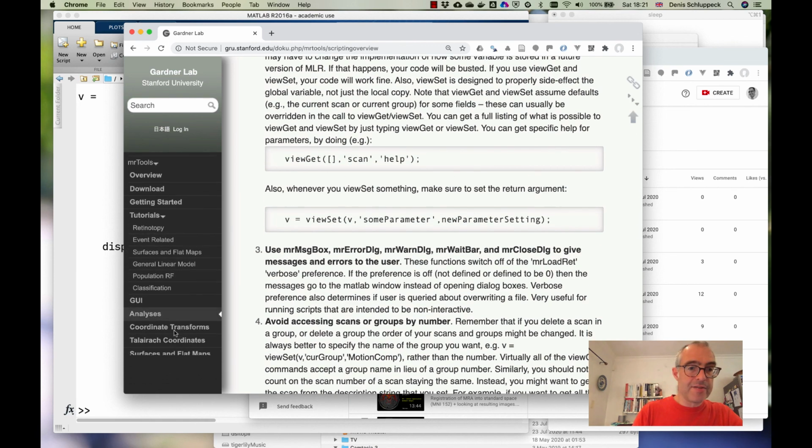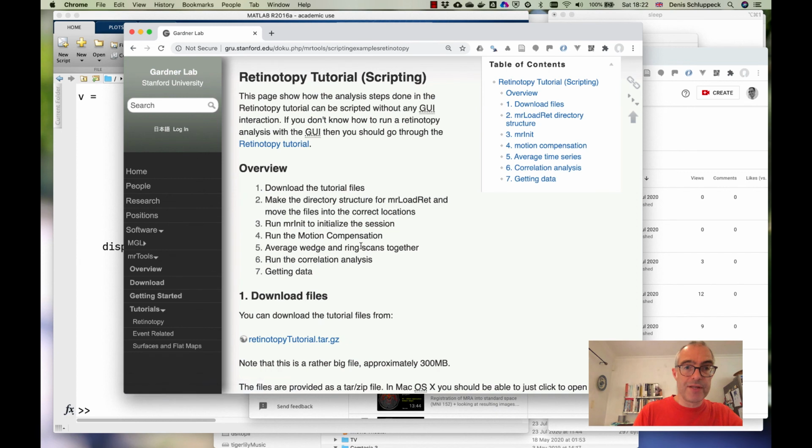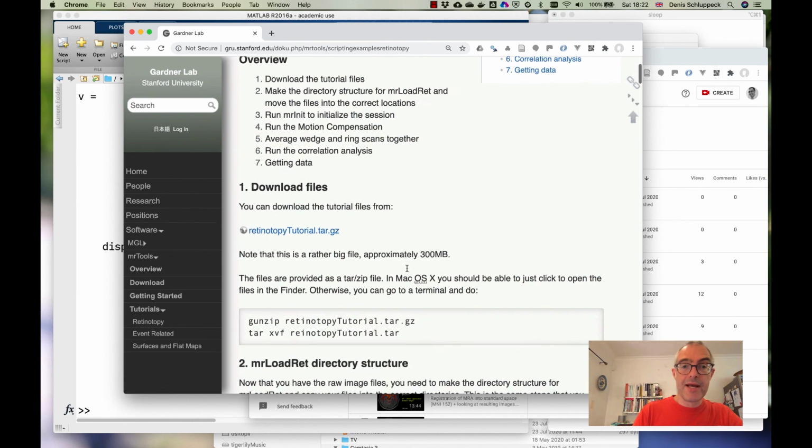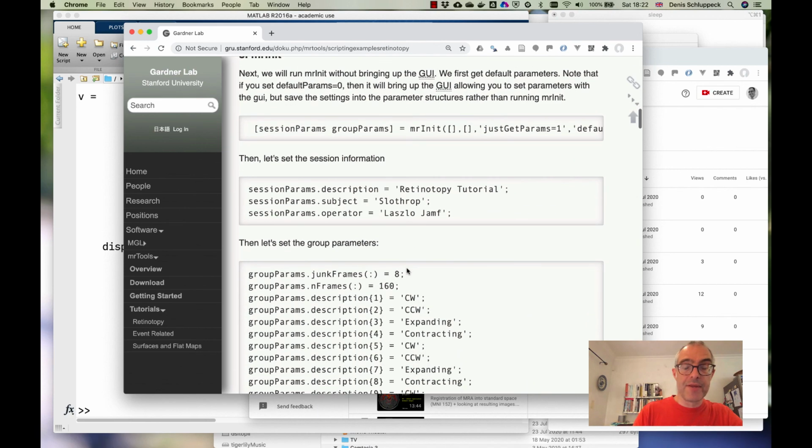The other thing that's useful is there are some examples of how you could use this scripting if you collected a data set, say across 5 participants, and the data is all acquired in the same way, the data files are all very similar, it's just the names that are changing. Then rather than doing these analyses by hand, you could write a script that will do them for you. This gives you a walkthrough of how you could achieve that: all scripting from the beginning to the end.